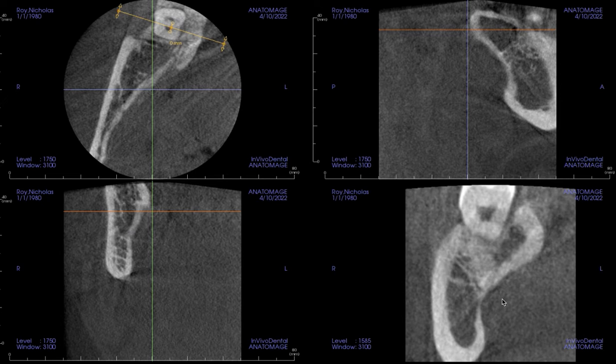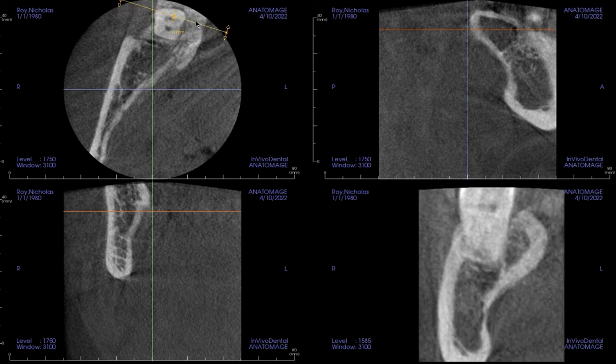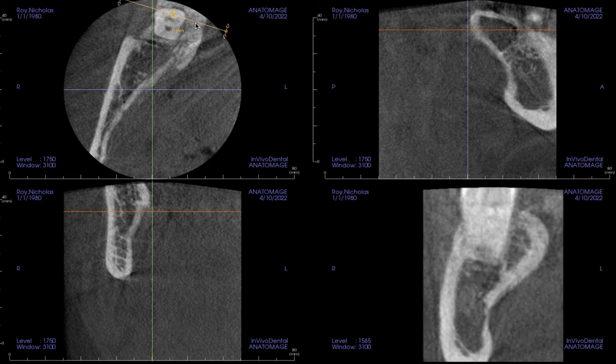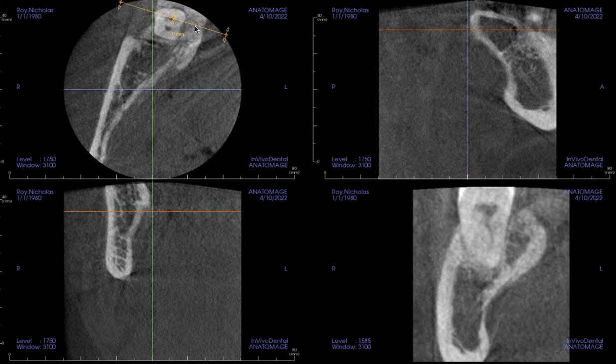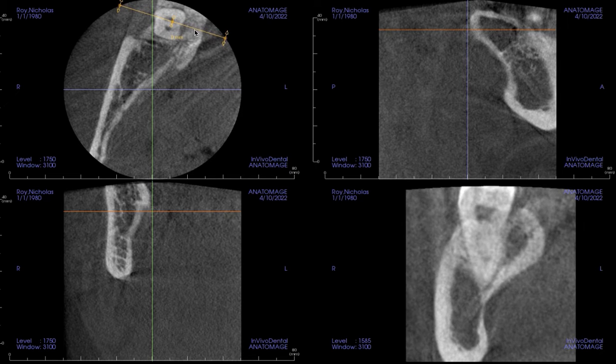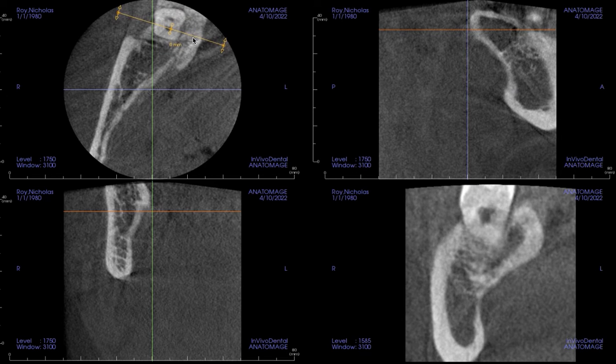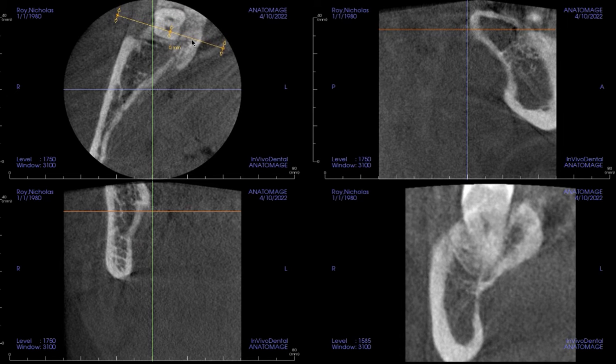Obviously, the shoulder operation I had 10 days before, I think, may or may not have had something to do with this. My original assumption was the following. All right, so we're looking at this image here. Let me just start on the mesial root so you get a full sense of the tooth from this axial slice. So there's the mesial root system. Really nothing significant there, no decay in the tooth. I don't have any parafunction, so I wouldn't think there's any cracks.